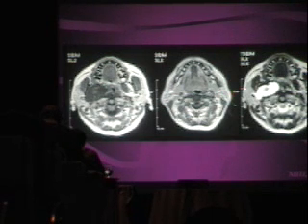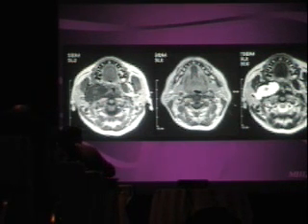All right, here's a lesion. What do you call this vein that's just behind the mandible? The retromandibular vein. Why is that an important landmark? Because not only does it separate the deep and the superficial parotid gland, but what nerve always travels in this space just behind the retromandibular vein? Facial nerve always goes through the parotid, separating deep and superficial parotid just behind the retromandibular vein.